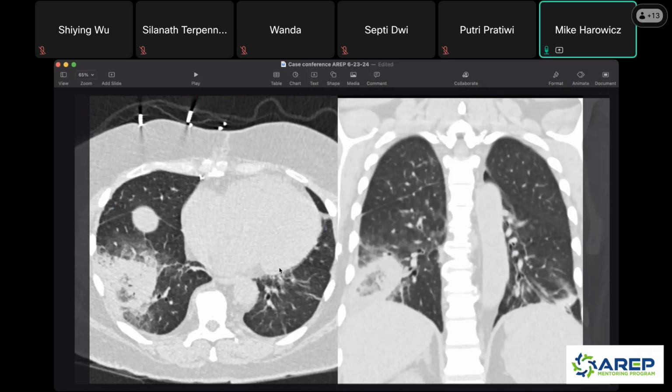And the most interesting thing for this patient is their history, right? So I mentioned they had the heart transplant. Anybody who has a transplant is going to be immunosuppressed. So you need to be thinking about all those weird infections that they can get, and really any infection at all. Those people are very, very prone to infections. Does anybody have any idea of infections that can give you this sort of look?